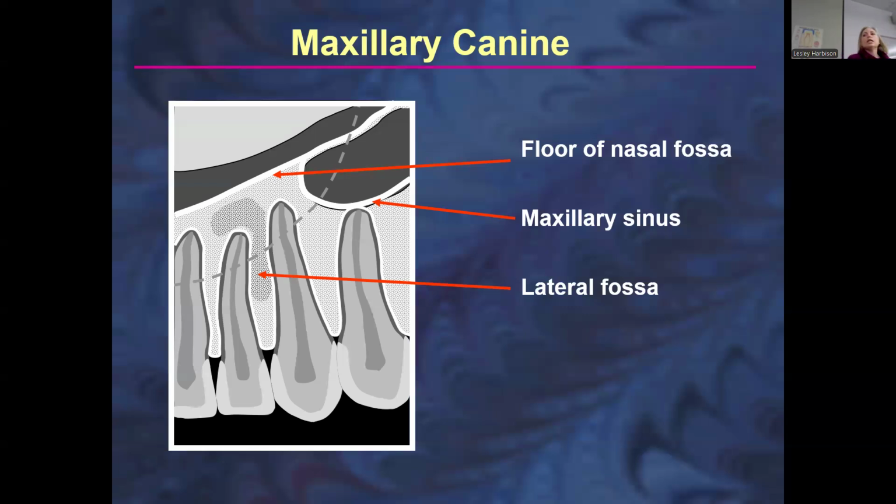Yeah, your premolars. So when you're looking at a canine image and it's labeled with an arrow pointing at one cavernous thing, just look straight down and ask, are those laterals or are those premolars? That sounds super easy, unless you get a really weird image with a lot of distortion where the teeth look funky, which can be harder.